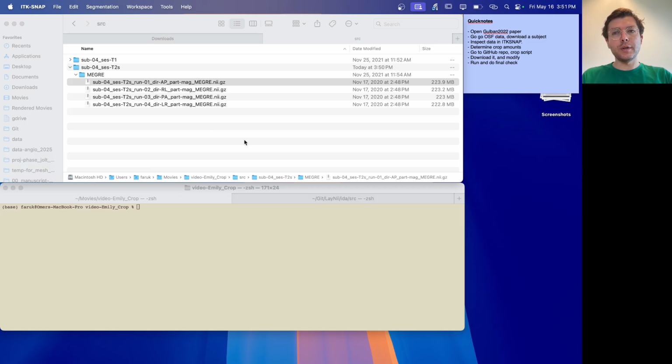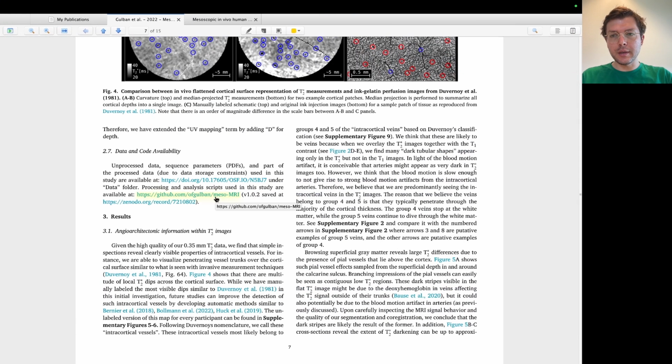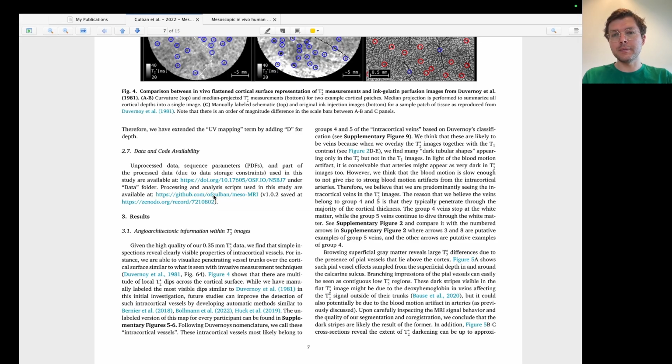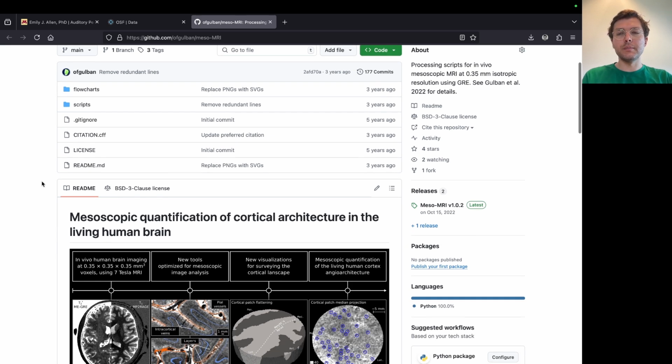And just to be complete, I would like to show you that when we click on the same section, the second link that leads us to the analysis scripts, here a GitHub link, you can see that here is the repository for holding the analysis scripts that I have used in this dataset.